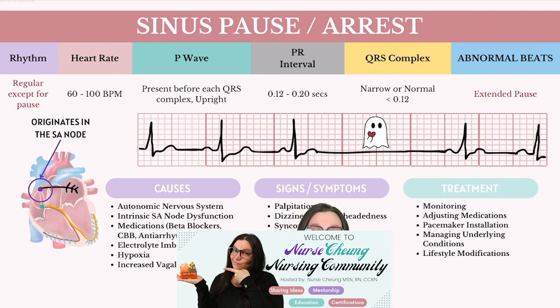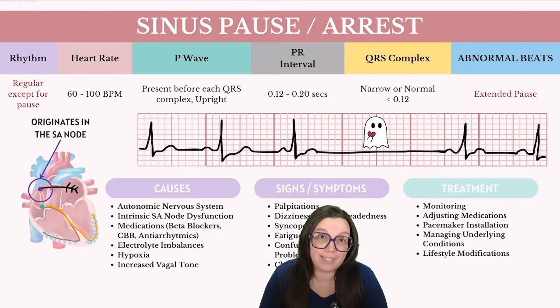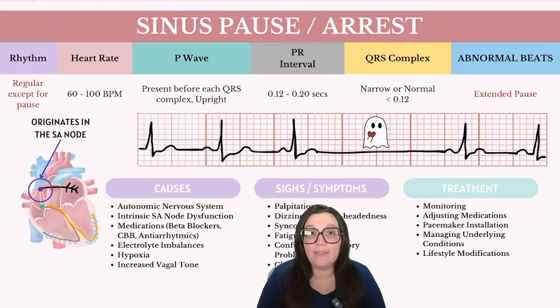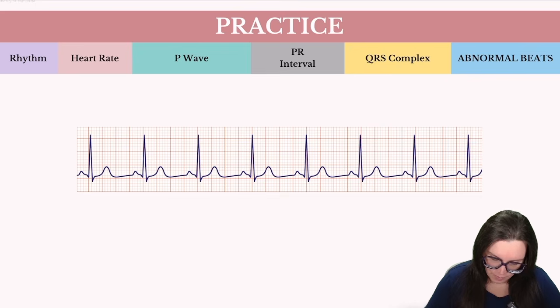Treatment for sinus pause or arrest aims to address its underlying causes as well as the severity. In some cases, we may need to adjust medications, depending on if that's the cause, and in other cases, we may have to implant a permanent pacemaker if we see repeating episodes. So let's do some practice on identifying these rhythms. So first up, we have the following rhythm.